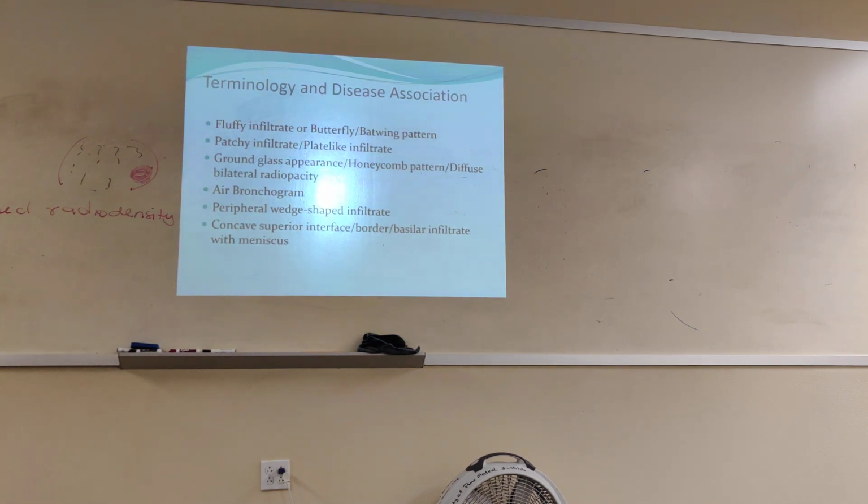Patchy infiltrate or plate-like infiltrate, that will be atelectasis. Like I said, if there's anything at all that you want to associate infiltrate with, you can associate it with atelectasis, but it does not mean atelectasis. Okay, when they describe it this way, patchy or plate-like or thin infiltrate, you say atelectasis, for sure.